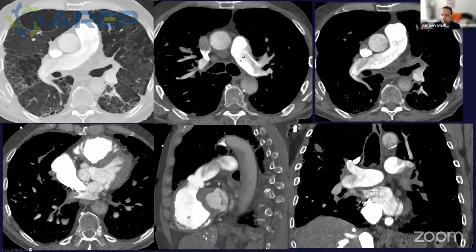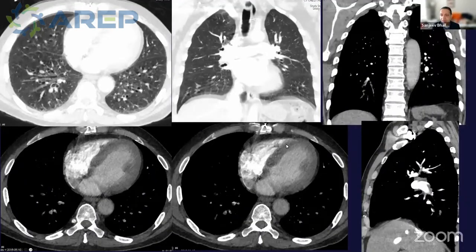Another example of flow artifact. This is a person who had been imaged on our new photon counting detector CT, history of emphysema and pulmonary fibrosis, severe pulmonary hypertension, but notice how smoky the flow is. It looks almost like a smoke cloud, and you could really appreciate how this flow artifact could be confused for pulmonary embolism. And to be honest, this is something we've noticed is true in our photon counting detector CT, which is much more sensitive to these flow phenomena, so it's useful to know about.